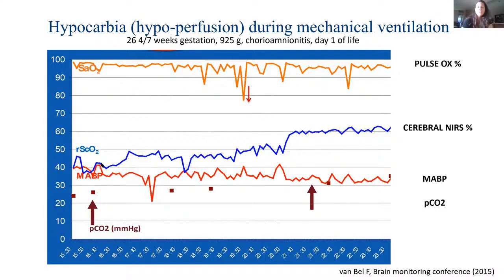And just as a reminder for cerebral saturations, we want them somewhere between 60 and 80, and below 50 is that cutoff of danger. So we like them, again, 60 to 80. Not that higher is better, but just in that range. So you'll see that as the PCO2s are really low, look how low the cerebral sats are.